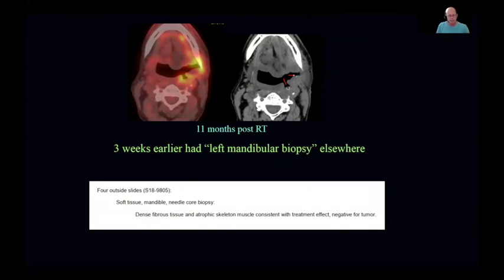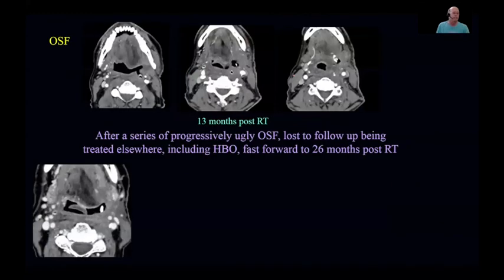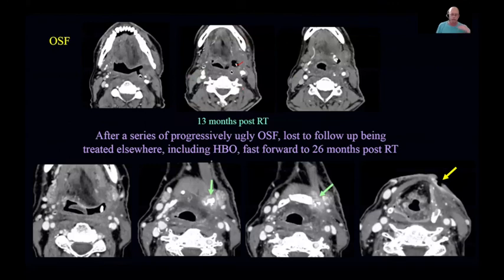They biopsied it and on the outside, and they got no tumor. These stories sometimes become complex sagas. We can see that there's a bit of exposed bone here, and even though the patient had hyperbaric oxygen, long story short, there's a lot of abnormal enhancement here.